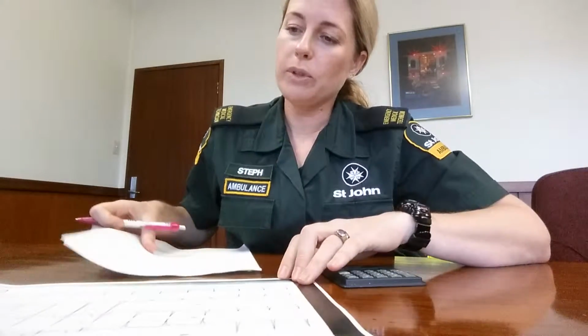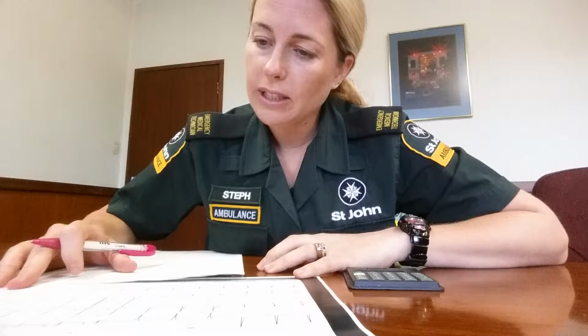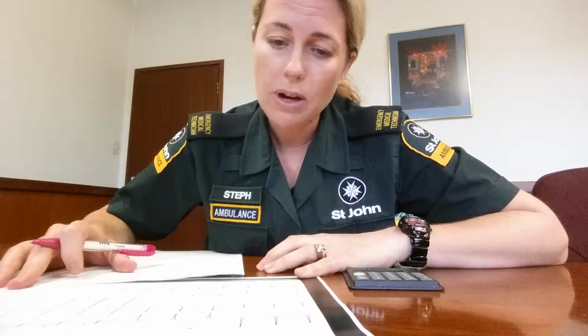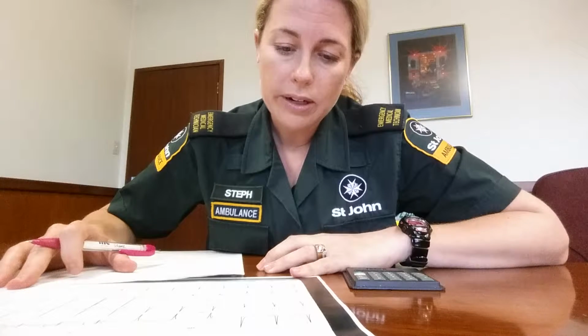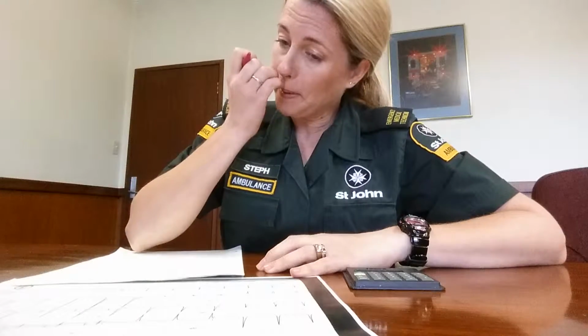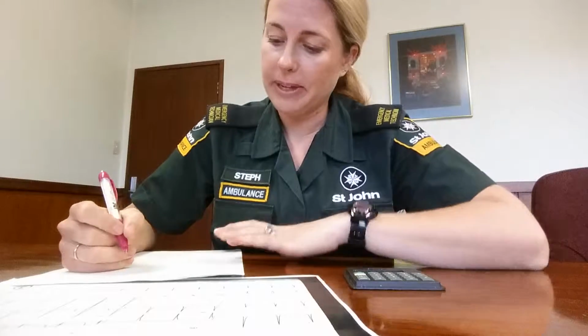Okay, so I'll start with general impressions. Got some very tall R waves in the precordial leads. Got a little bit of elevation looking at V1. And I've got delta waves in 1 and 2. It looks like a somewhat irregular rhythm. Nothing shouting out, screaming terrible at me.